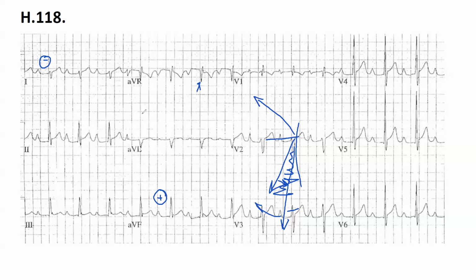Next, we can look at the ST segment, pathological Q wave, and size of the R. Pathological Q, I don't see any. No, me either. The size of the R in V4, V5, and also V6 seems quite large. If you see more than 25 millimeters in V5, and for sure this is more than 25, that means we have a left ventricular hypertrophy.